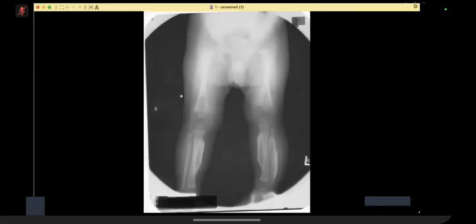So if this patient has pain and swelling over the lower limbs, this could represent infantile cortical hyperostosis, Caffey disease. Although I would like to review also the ribs and the clavicle and the mandible, because it's most common in this site. The other possibility would also include prostaglandin E administration due to abnormal congenital heart disease, which kept the ductus arteriosus patent.